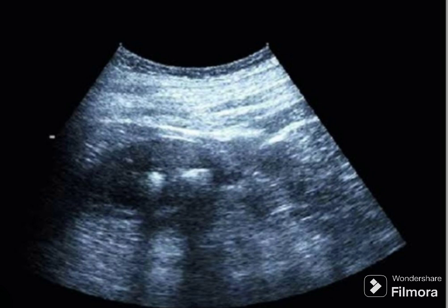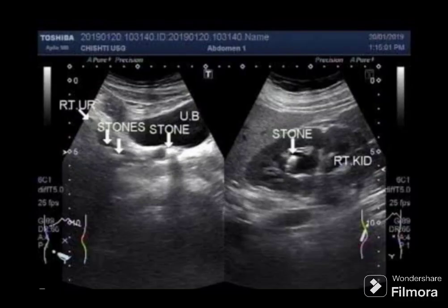In this pic, inside the kidney, there are two renal stones which produce a blackish shadow. Carefully look at this pic. These are renal stones, not renal concretions. Again, look at this picture. Below the urinary bladder, the whitish thing is called a stone, and behind the stone there is a blackish shadow which confirms that this is a stone, not concretions.